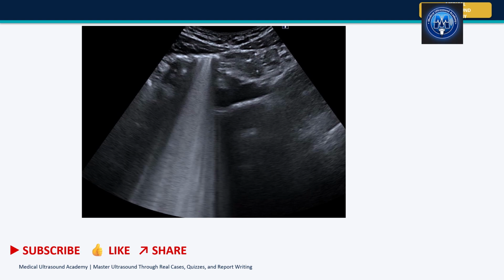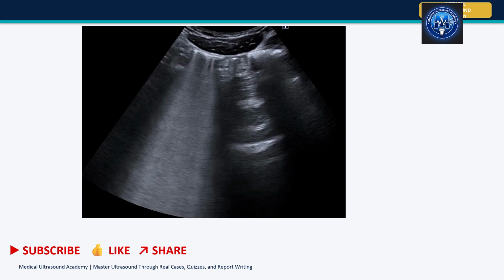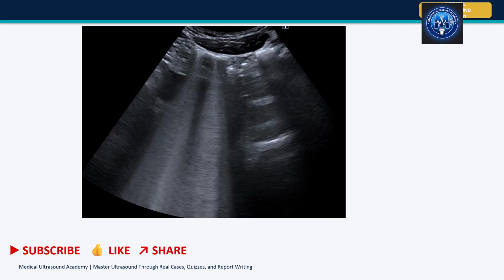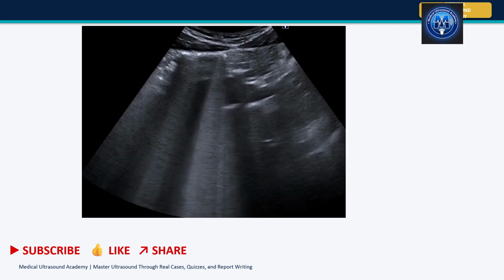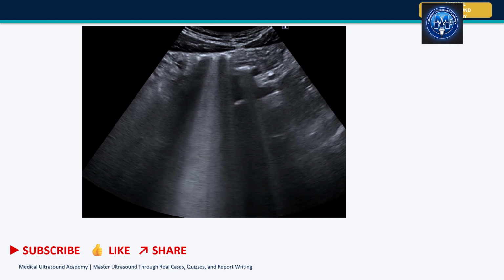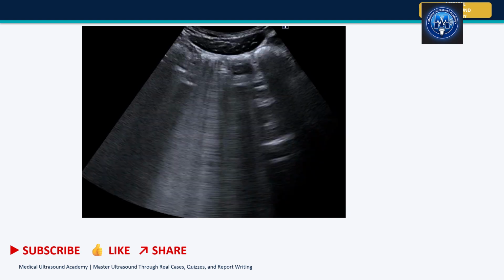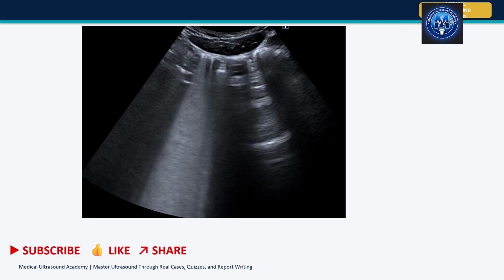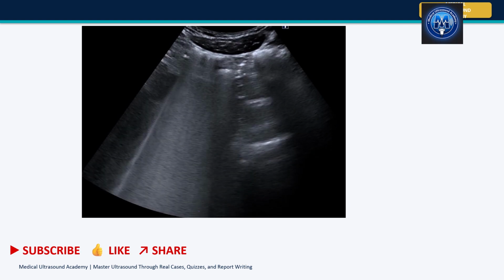So when you're writing a report, we must also mention the limitations, to say that maybe the patient is not fasted enough. Or if the patient is fasted enough, then you can talk about the bloatedness due to the gas. Say that this and that organs couldn't be visualized, or they were just partially visualized.